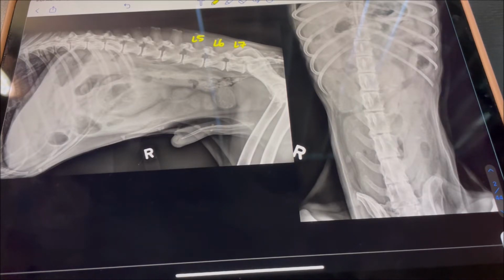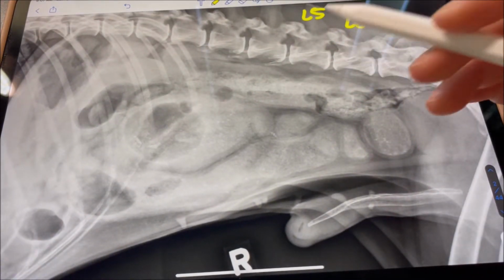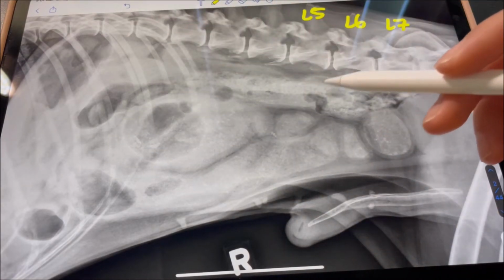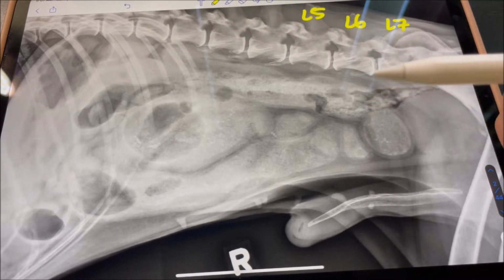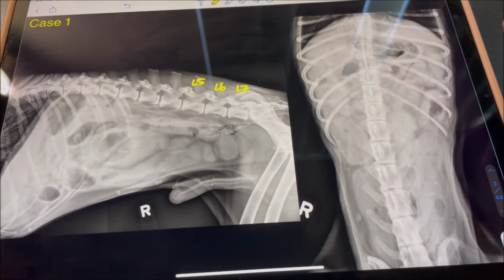into the gravel sign. And because it seems like this is a diffuse dilation of the small intestine, it's all throughout the duodenum, jejunum, and ileum, we can estimate that the obstruction is located most likely in the distal region of the small intestine, such as the ileum. Now, in VET415 GI block, we learned that this specific combo of dilated bowel loops and gravel sign is very indicative of adenocarcinoma, so that's what we should be suspecting.